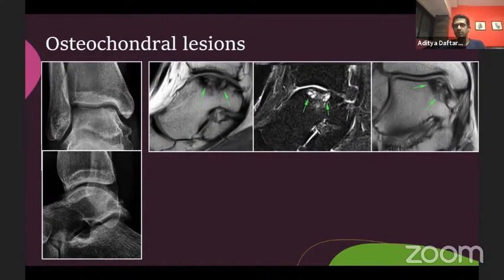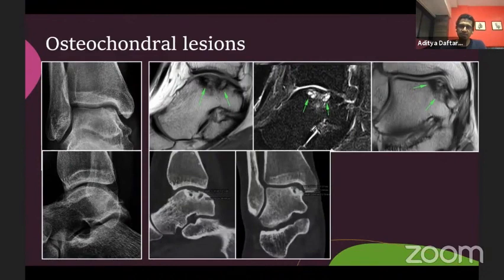And then all the orthopedic surgeons look at it and say, but what does the bone look like? Show me what the bone looks like. And that's where I think CT gives you a great idea. You know how much that bone is irregular, you know how much you're going to scallop into that bone if you do anything.